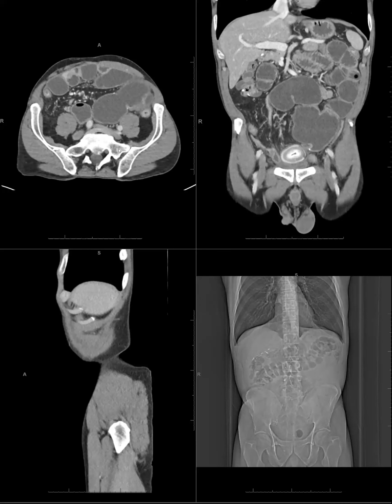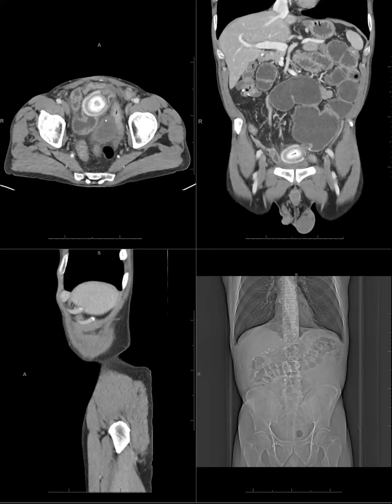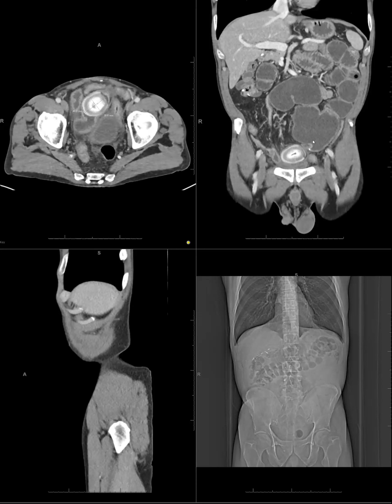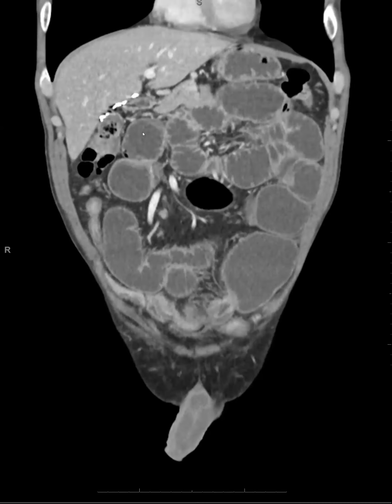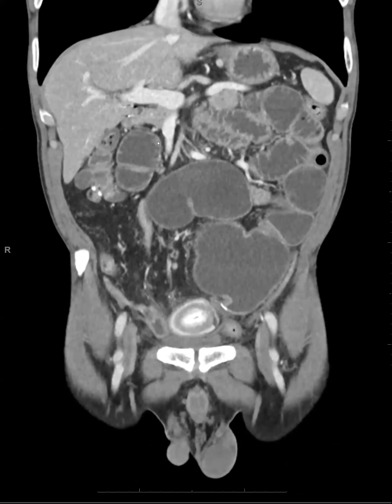Which one I'd say for sure is the truth, except like I said, the lamellated appearance makes me think gallstone, because most of the fecaliths I've seen don't have an appearance quite like this. I guess the secondary signs aren't there, though, like air in the biliary tree. The gallbladder's been out quite a while. This is the only imaging I have, but I think it's a remote history of cholecystectomy.